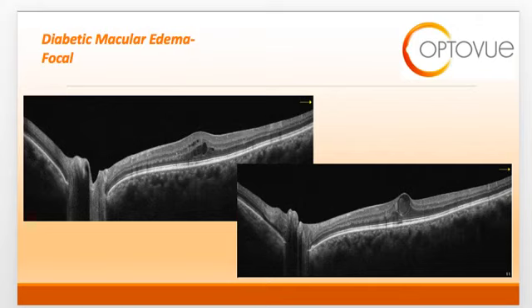On these OCT scans, you can see the hyporeflective areas that are very focal in nature, representing the diabetic macular edema. You might want to also take note of whether or not the diabetic macular edema is involving the fovea, or what we like to call center-involved diabetic macular edema. Center-involved DME has much more of a weak prognosis than non-center involving DME and requires urgent referral to the retina specialist.